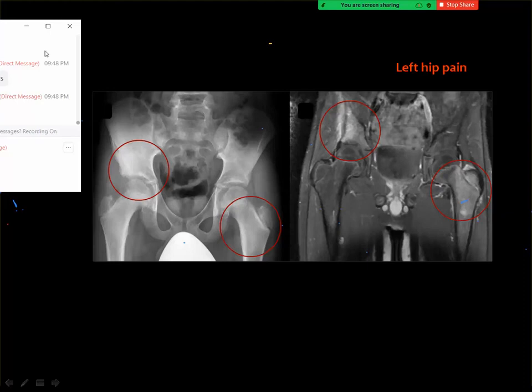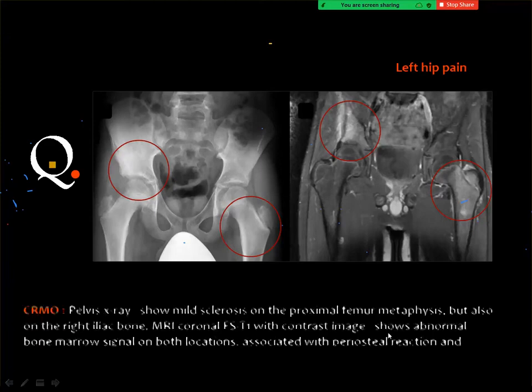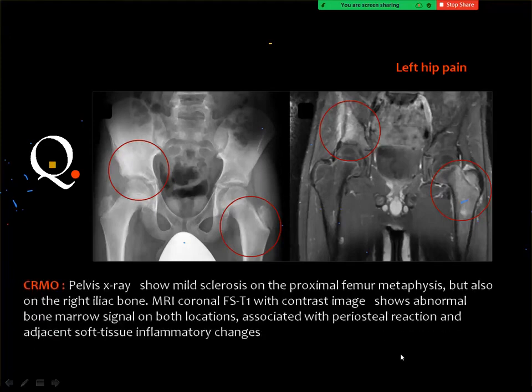Yes, and this is chronic recurrent multifocal osteomyelitis, as I have mentioned before, and I said that this lesion is frequently seen in clinical practice, so you should remember this possibility. You get a young person with multiple areas of bone marrow edema, no history of trauma, and no significant signs of infection. Then one of the classic histories, whenever you hear it, is the recurrence. This is a recurrent disease.